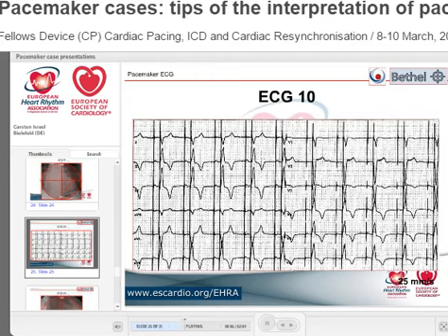Now what is really funny, one of my favorites, Haran Buri knows this, I think he will get red in his face. Lead Roman 1 is deeply negative, absolutely nothing positive. What does it mean? Yes, so if you see this in lead 1, you should be a little bit unhappy because it means that the heart, lead Roman 1, is going from the right arm to the left arm.